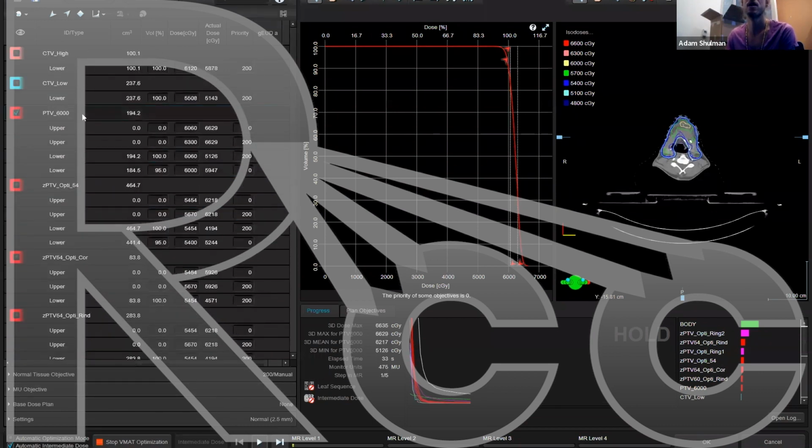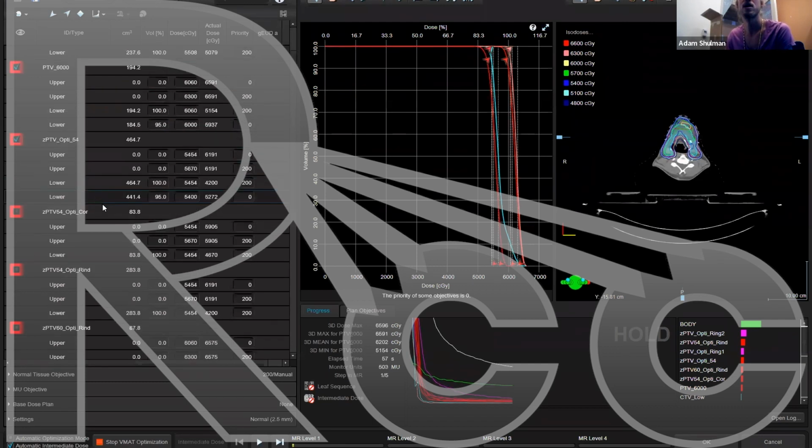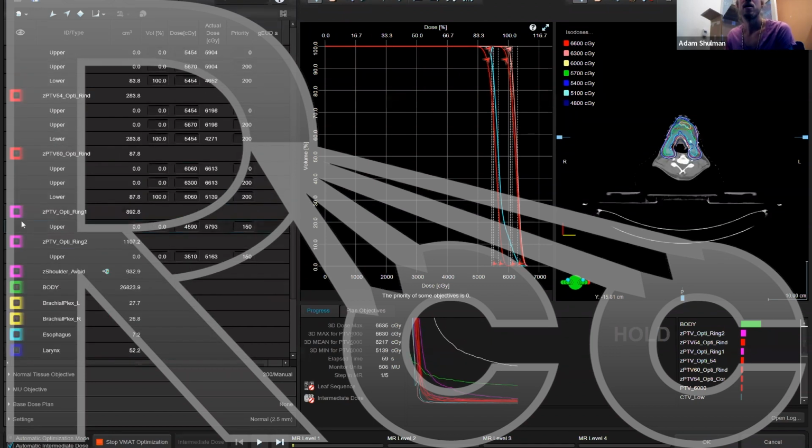Okay, so I'm just going to turn on a couple of these. Oh, I also put a CTV in here at 1% higher than my original objective. So 100 at 1% higher than prescription. And this is 100% coverage at 2% higher than prescription. So I put that in as well. So we're just going to turn on a couple of these. Here's my Opti 54. I'll put on my rings.